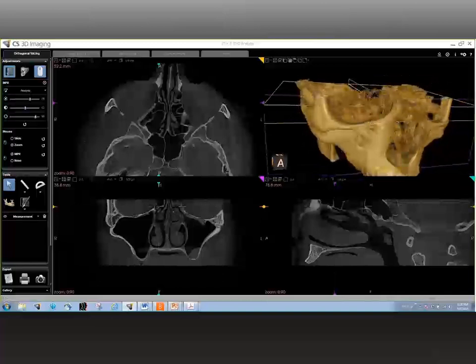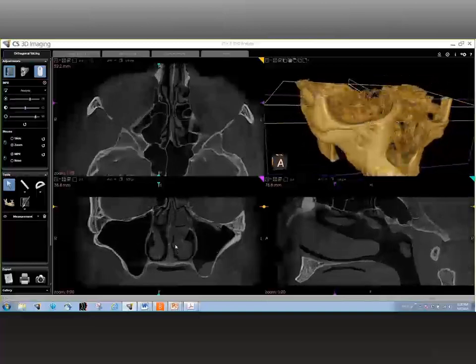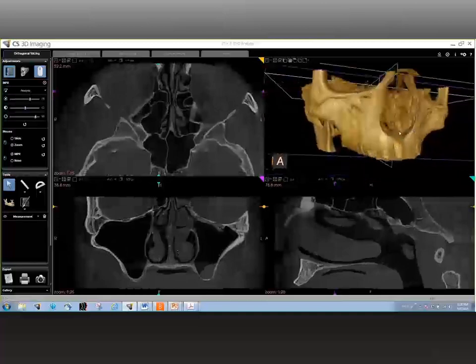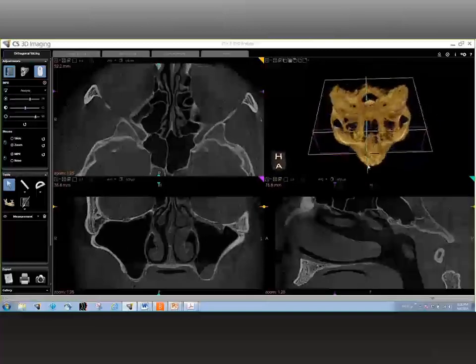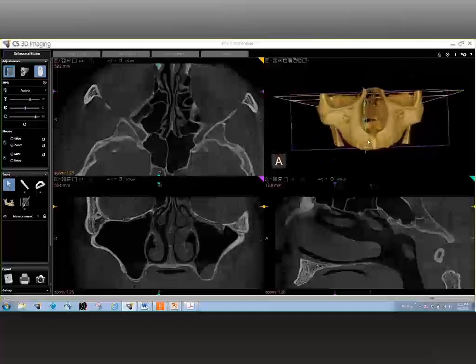Well, that's a very good question. The sinus health is important to discern and distinguish from any sinus disease, or to distinguish any sinus disease from pathology of odontogenic origin. What I am trying to say is that there could be some pathology that's located in the sinus, which may not be exactly due to a problem that originates from the sinus.